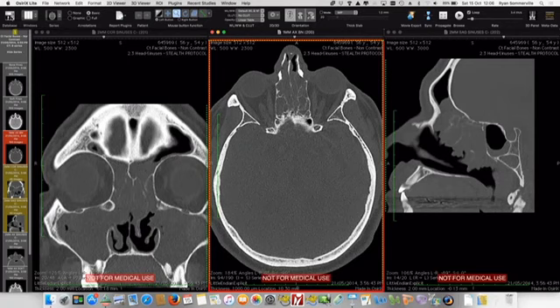But the reality is that most of us create a 3D picture, which was described by a guy called Professor P.J. Wormald in Adelaide. It's about getting little blocks and then working out in your head where the blocks are in relation to each other, and that's in 3 planes, so it's this way, that way, and above each other. So it's quite complicated, but that's how we approach sinus surgery.